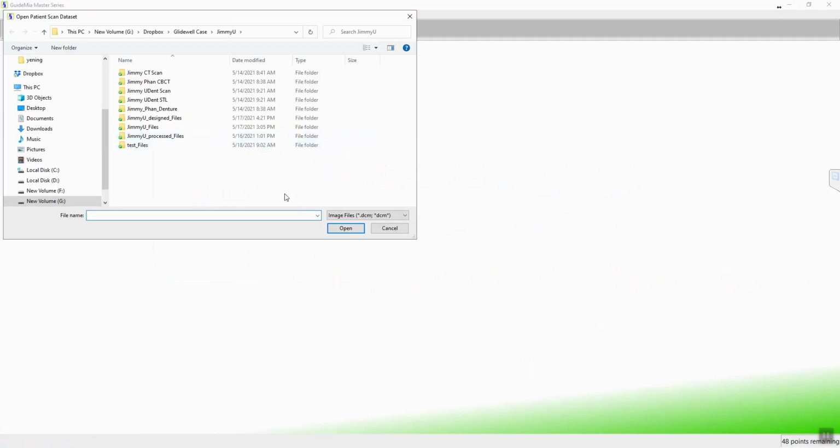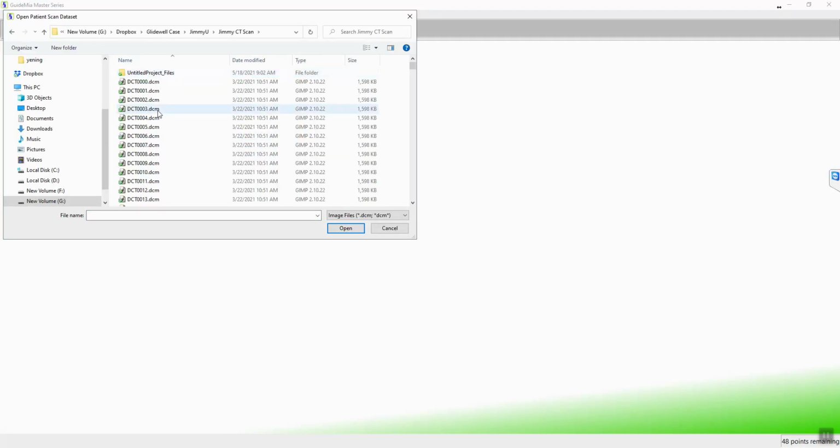Thank you. So let me load the case. I'll go find the patient CT scan and load it.